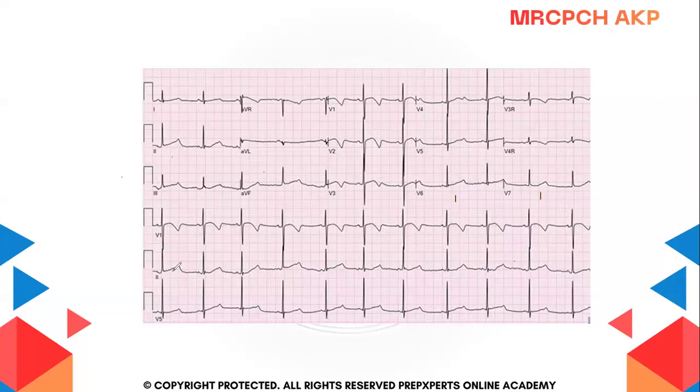So here you can see, from here to here, it is more than two boxes, roughly more than two boxes here also. It's pretty long.